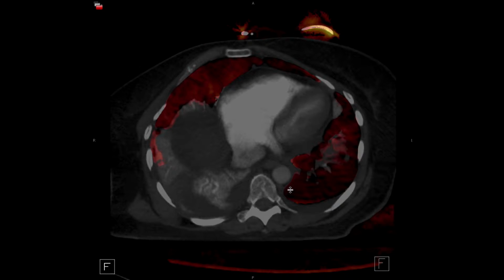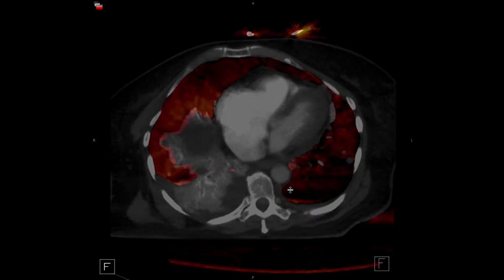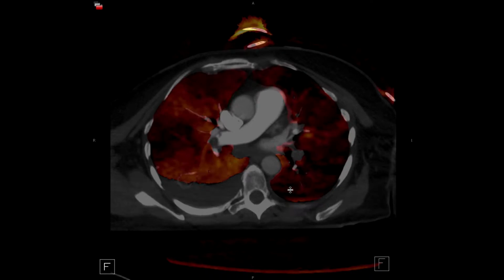These don't necessarily translate into pulmonary infarcts. They're just perfusion defects. You should be aware, though, that in the setting of acute PE, many pulmonary emboli will not cause perfusion defects because they're non-occlusive, and this simply requires intravenous contrast to pass around the clot, in contrast to the VQ scan, where you actually have particles, which of course will be stopped by even not totally occlusive clots because of the size of the particle.